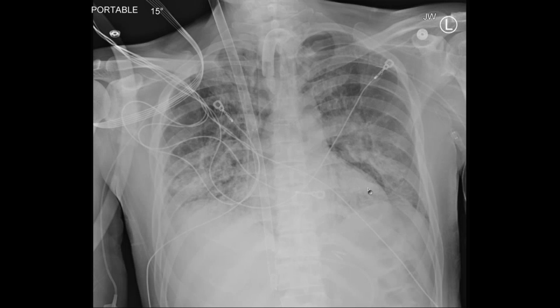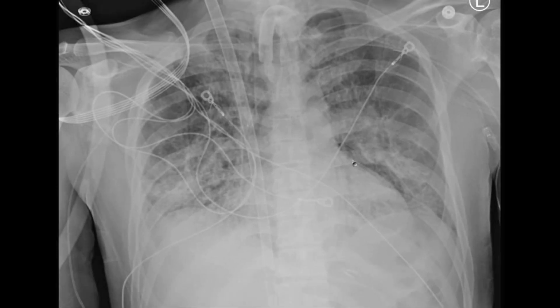So what is happening here is that there is air that's paracardiac, it's in the paracardiac fat, and sometimes, for lack of a better description, I call this the appearing, not disappearing, but the appearing heart sign, in the sense that when you have a situation where fat effaces the cardiac apex, if you put air in the fat, you then get a sharp interface between the heart itself and the air in the mediastinum.